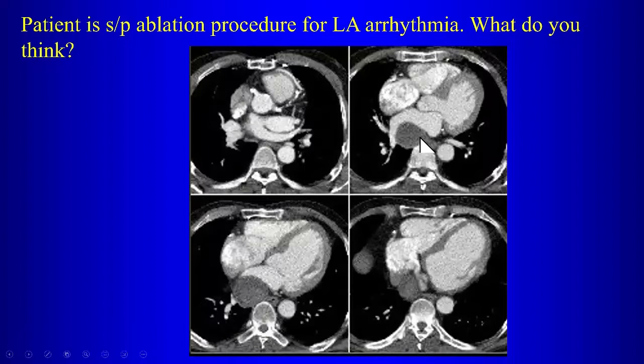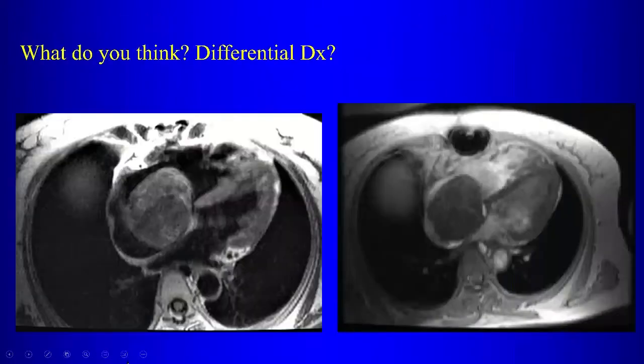It's not a cyst. This occurred after treatment for ablation, after the ablation procedure. So this represents hematoma, right. So this is hematoma that has occurred within the wall of the atrium after this patient's ablation procedure. Okay, and that can be a complication of this procedure for treatment of atrial fibrillation.